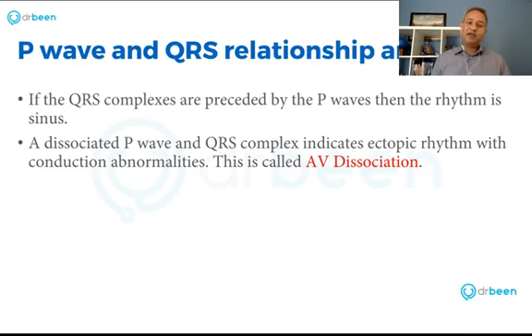Now, P wave and QRS relationship analysis.